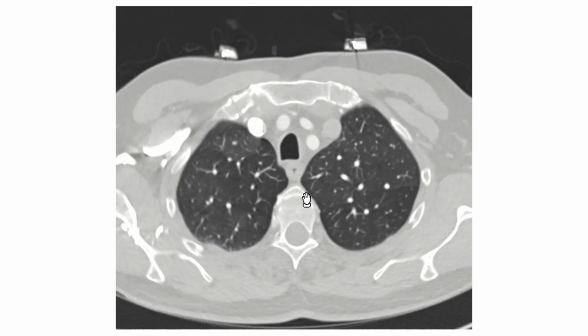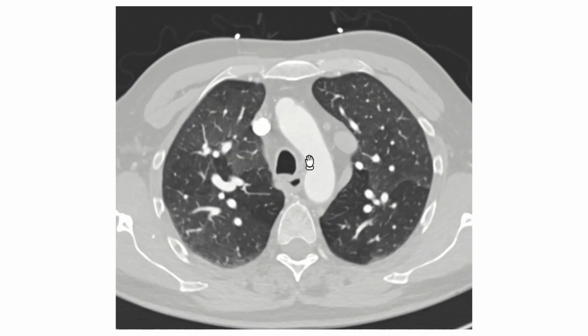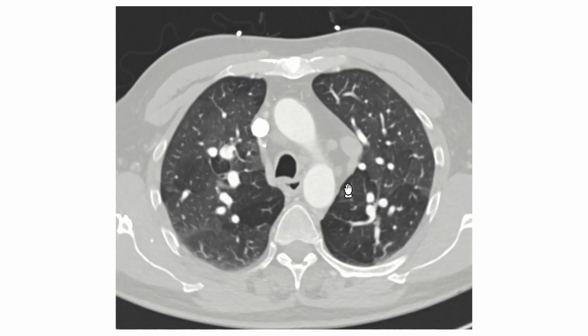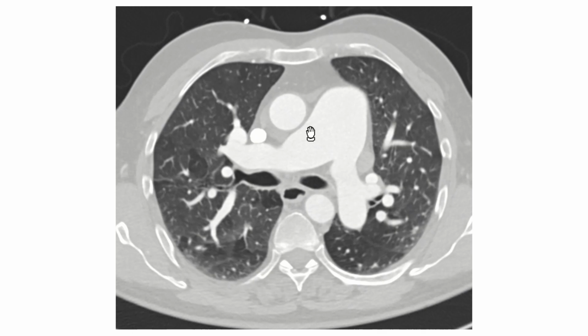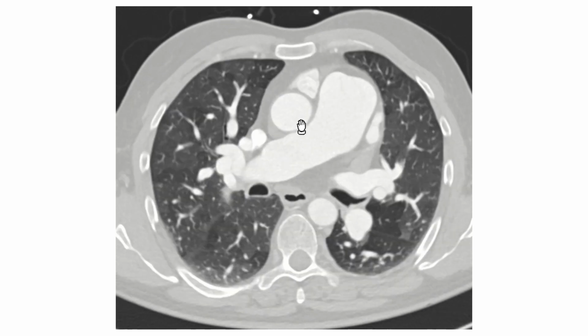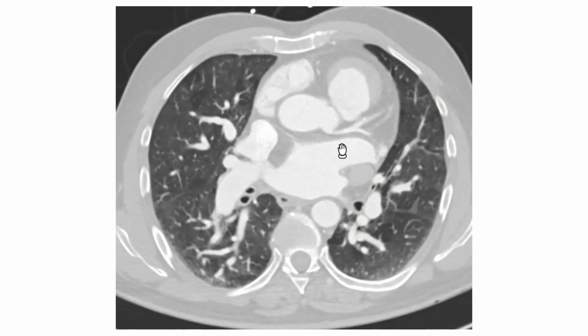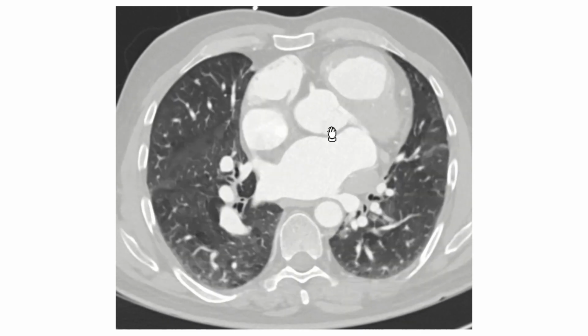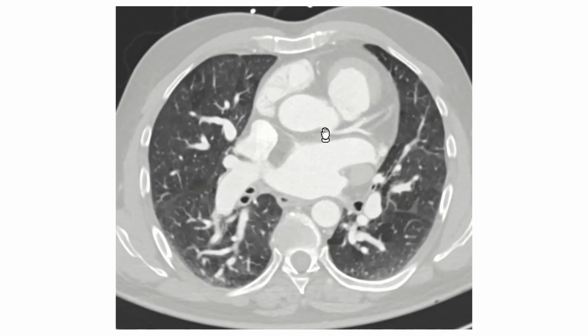Again, if we scroll further down, we could see the supra-arch vessels, which have conventional branching. It is a left-sided aortic arch, and we have two superior vena cava. We have a dilated pulmonary artery with normal anatomical arrangement, so we could say it's not going to be a TGA, because the pulmonary is on the left side, slightly anterior to the aorta. Scrolling further down, we could see the left coronary has a normal course and normal origin, similarly the right coronary, so it's a normal coronary origin.